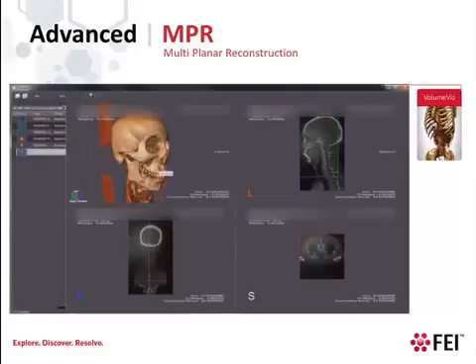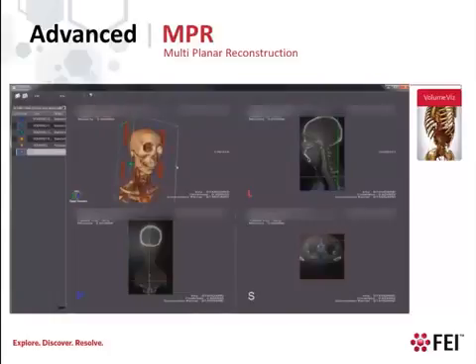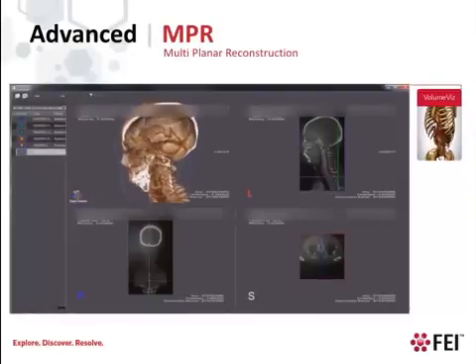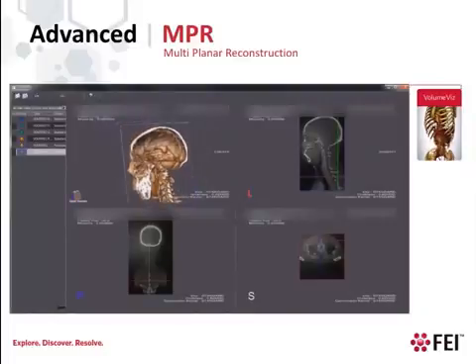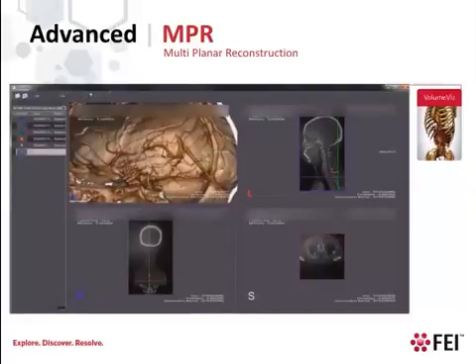We've already seen one example of a manipulator 3D gadget. This is the built-in region of interest manipulator that allows you to clip the volume along its major axes. This is very useful to see details in the dataset and to select hidden parts. Note that this is a fully interactive clipping operation, not actually cropping the volume. If there's not enough memory to load the entire volume at full resolution, Volume Viz will automatically increase the resolution as the region of interest gets smaller.